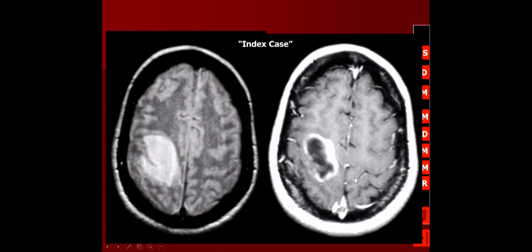And he looks at me and he says, "What else could it be?" That's the thing you never want to hear, is when someone says, "What else could it be?" So I'm looking at it and I'm going like, well, it's an adult patient, cerebral hemisphere, an irregularly heterogeneous ring enhancing lesion. And he looks at me and he goes, "Jim, what's missing?" And I said, "Oh, if he has a ring-enhancing lesion, why does he not have any surrounding vasogenic edema?